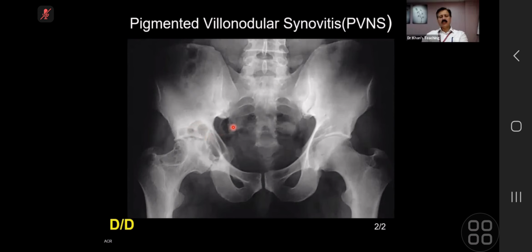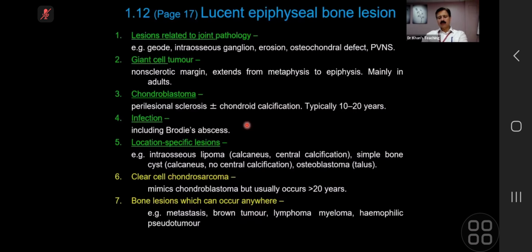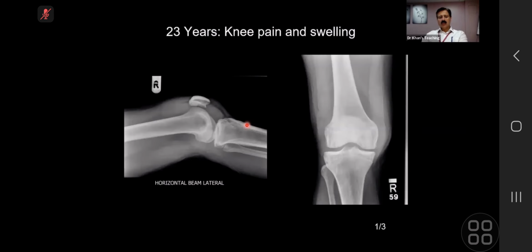And number two is that if there is no osseous extension, another point to remember is that it will have hemorrhage inside, and this hemorrhage will be low signal on T2 weighted sequence. So that is another point to remember. Now, if you see here, candidate 3. Yes.